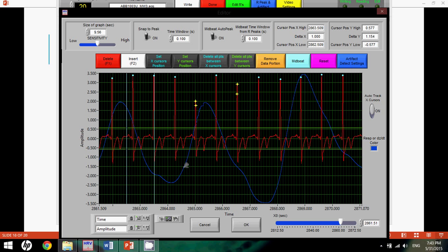Basically what the machine that's collecting the data in your lab is doing is trying to transmit information from a wireless signal. And in some cases that signal is interfered with, and when that happens you get little jagged edges in your actual data. And in those circumstances, which do happen somewhat frequently, some files more than others, your objective is basically to try to eradicate that variation when at all possible.